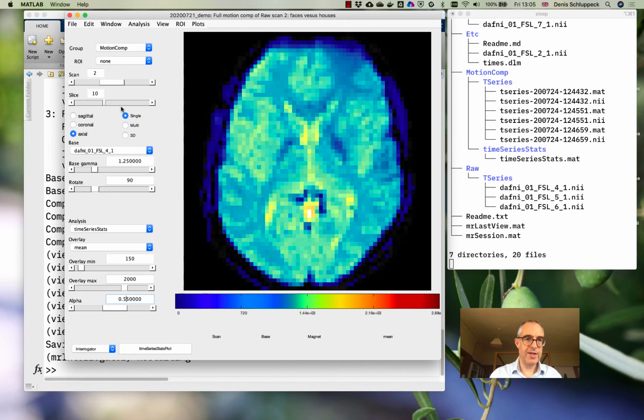There are various options for modifying this behavior, and this will allow me to introduce you to some of the options here. For example, in the edit window, under the overlay tab, we can manipulate these overlays and get some information.